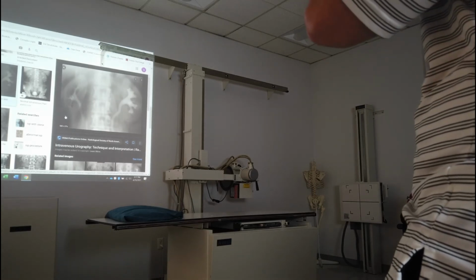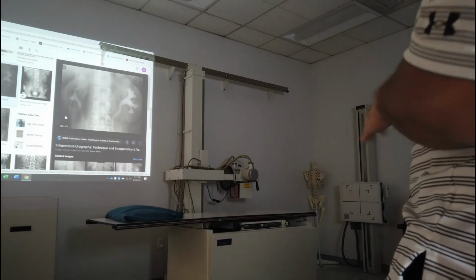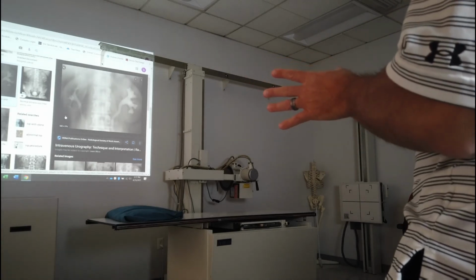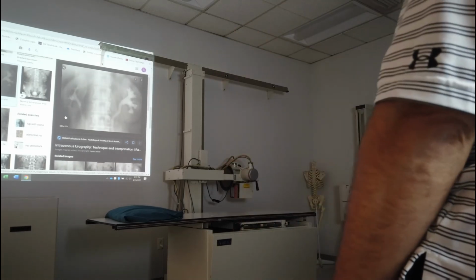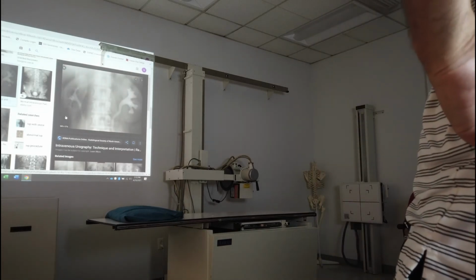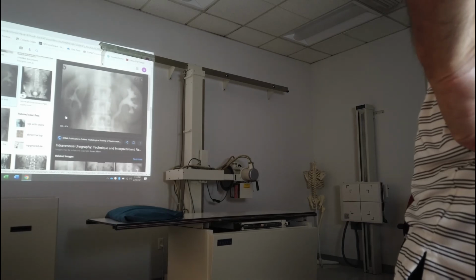The obliques. Obliques are the same thing as an oblique lumbar spine. You center at the crest, you go 2 inches medial from the ASIS. Same thing for an oblique lumbar spine. Only difference is you're at the crest versus a little higher. No big deal. And then there are some bladder shots: an AP bladder, an oblique bladder, and a lateral bladder. There's 5 of them total that you'll be responsible for. So it's going to be really quick.